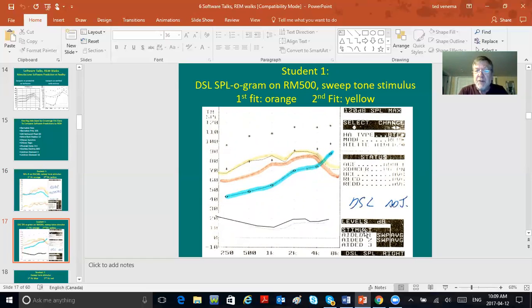And the stimulus coming in. Here's the targets. So here's the thresholds. Here's loudness discomfort levels. Here's the targets, the plus sign. What fitting method do you think this is? If you said DSL4, you'd be correct again, because the targets are sitting in the middle of the dynamic range. DSL5 doesn't do that, as we know.